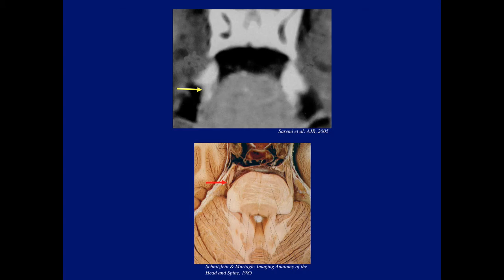Correct. It's metastatic disease. It was not a schwannoma. What disease? No, none of the conditions so far. Not breast, not lung. Very good. Our chief again hit the nail on the head. This was melanoma, meningeal carcinomatosis secondary to metastatic melanoma. Again, a disease we have to think about in our wide differential.